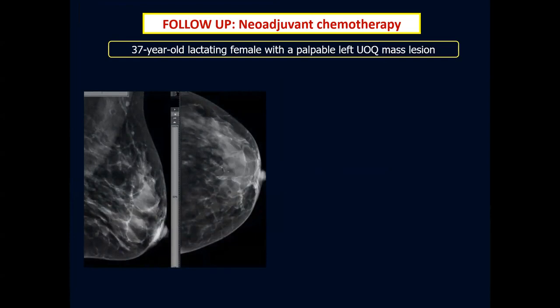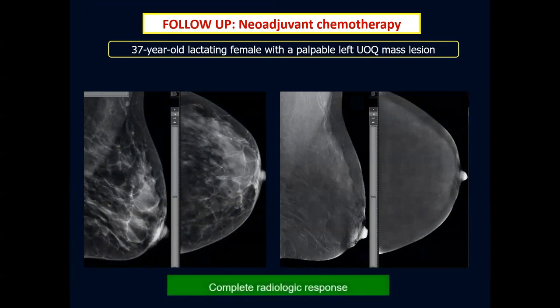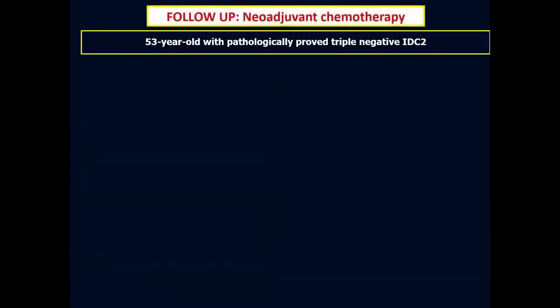This was her post-neoadjuvant films, and it is difficult to assess the response in the post-neoadjuvant films, while with a single look on the contrast mammogram, we can surely say that there is complete radiological response.